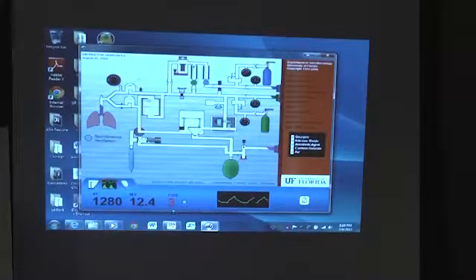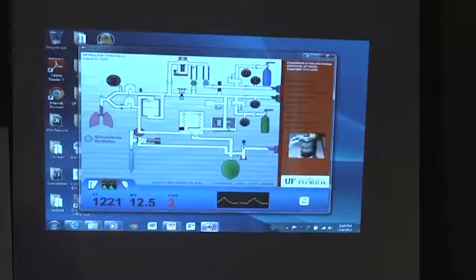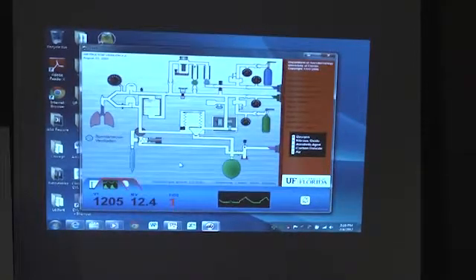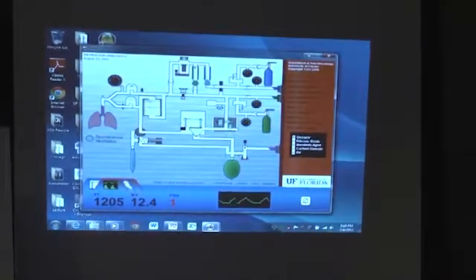So what should this be reading now, according to the setting on the flow meter? Is the O2 sensor intact? Looks like it. I inspected the O2 sensor, and I can even take it out and hang it in the breeze, and it reads 21%. Then I put it back in here, it reads 2% again.